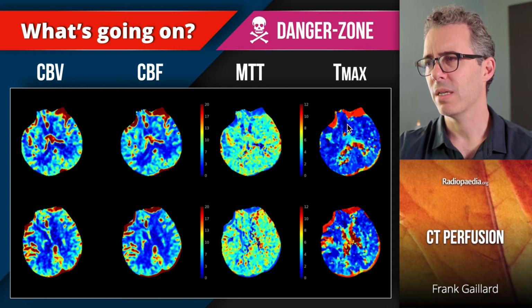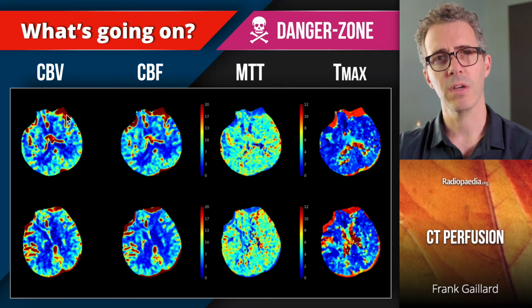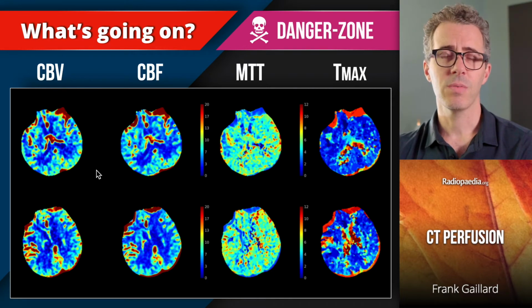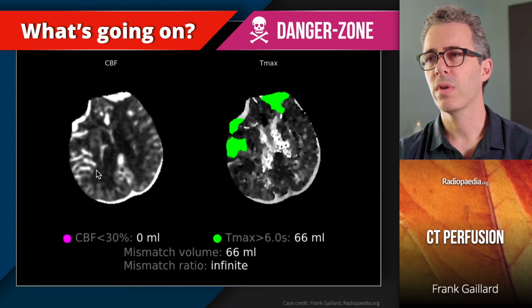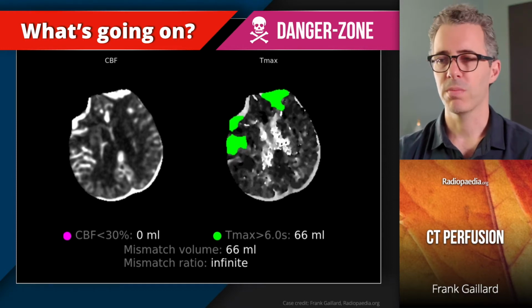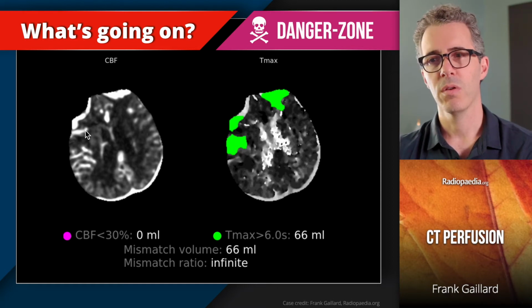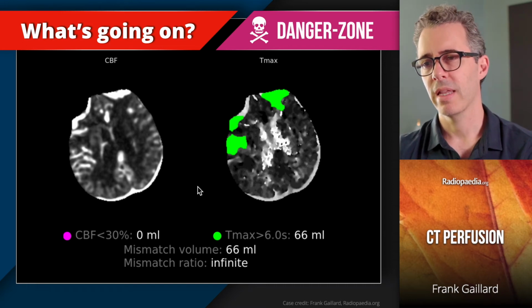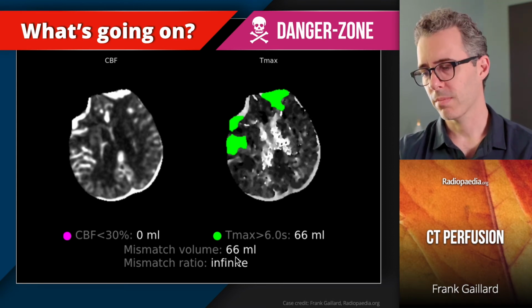Instead, we're seeing maybe some prolongation here anteriorly, but that doesn't make sense with MTT. And in this instance, also CBF and CBV are elevated, a little bit like the previous case. And the temptation, when things get complicated on these normal maps, is to rely instead on the automated maps. And when we look at this, it seems to make you feel much better, because in the area that there was a calcific embolus, we see an area of penumbra with no matching core, and maybe some other areas in the frontal lobes. Again, we're given these values that give you the impression or illusion of accuracy.